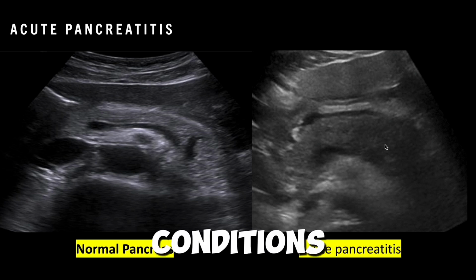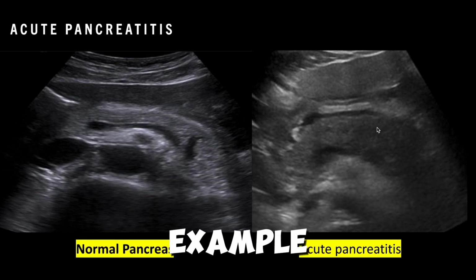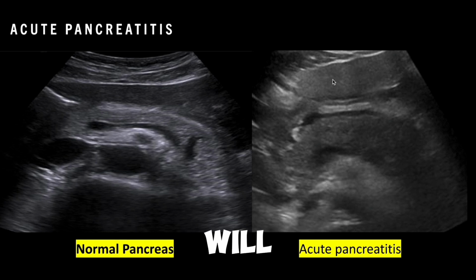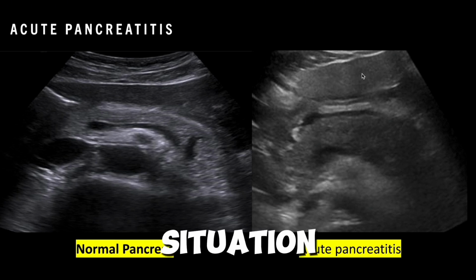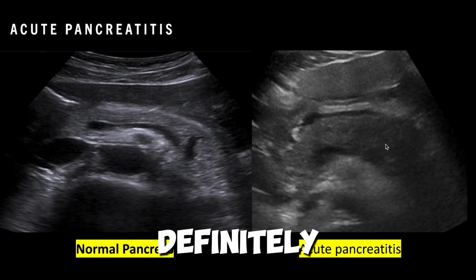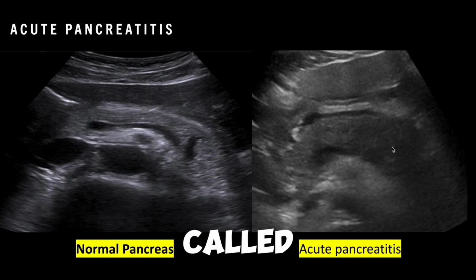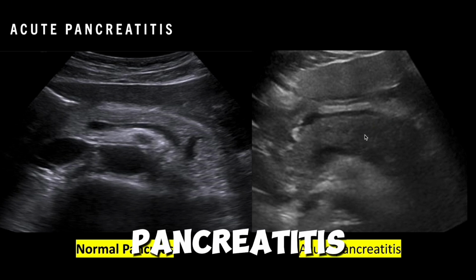However, there are certain conditions in which pancreatic echogenicity can be lower than that of the liver. For example, if the patient has fatty liver, then the echogenicity of the liver will be quite high. In that situation, if we compare the echogenicity of the liver with the pancreas, then definitely the pancreas will be hypoechoic. So this is called pseudo-pancreatitis. But generally, if we see a hypoechoic pancreas compared to the liver, then this is a finding of acute pancreatitis.